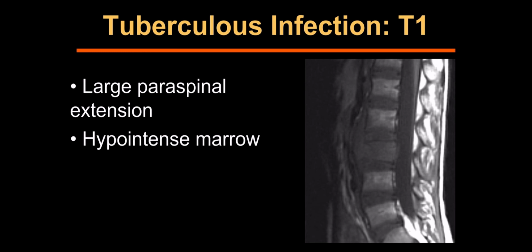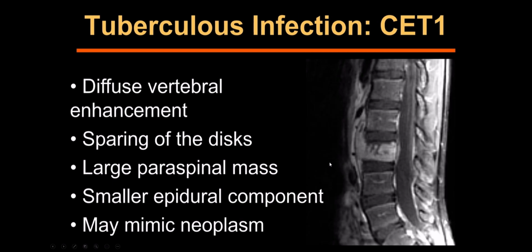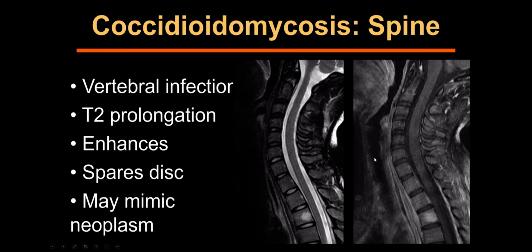So many of these cases go to biopsy that I do the spine biopsies at my place. And so when something that looks like this comes in and it says, evaluate for neoplasm, I put on a TB mask, and I ask my team to put on a TB mask as well, because occasionally something that's advertised as a neoplasm comes back as TB. Okay, you can look at the T2, I don't know, still looks like neoplasm to me. Look at how nicely defined those end plates are. And even contrast doesn't help you all that much.